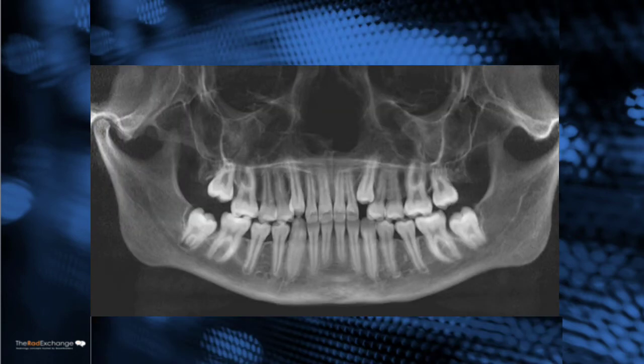A panoramic is generated based on the curvature of that particular patient's jaw form, so we just get in focus the teeth and the jaws. We don't have the hyoid, superimposition of structures, airway, or anything else that's going to interfere with our understanding of how the teeth are behaving in the jaws.